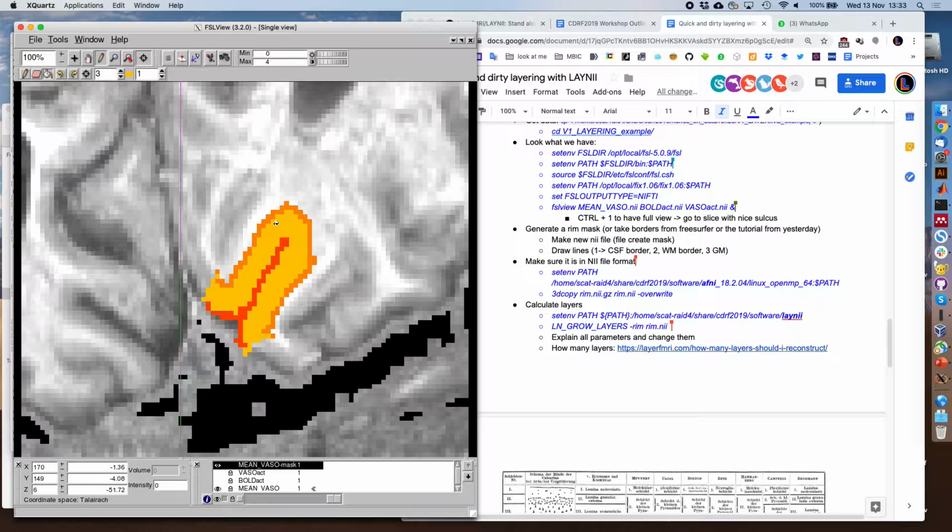Right, you can. Here you're almost perpendicular, so I would go a bit down, maybe draw here. Your windowing is kind of weird from the roof, so maybe you can go there and change it to 8. And this is kind of small too, with control. Bigger there. You can zoom in a bit. Here you have a kind of nice surface. You would fill it down a bit better.